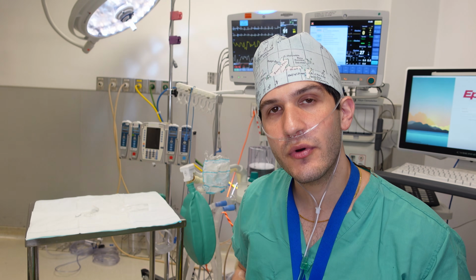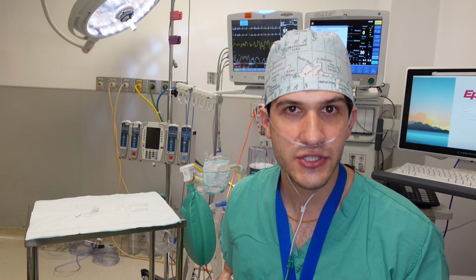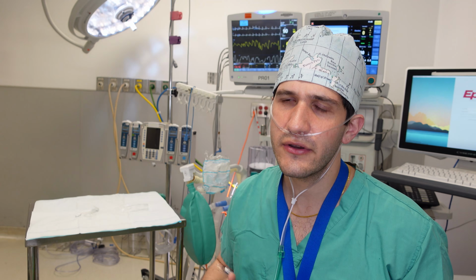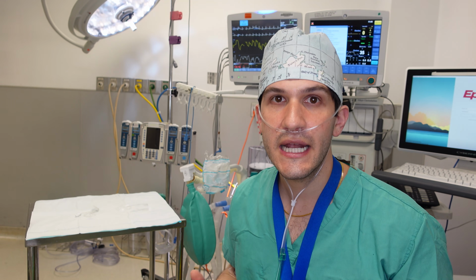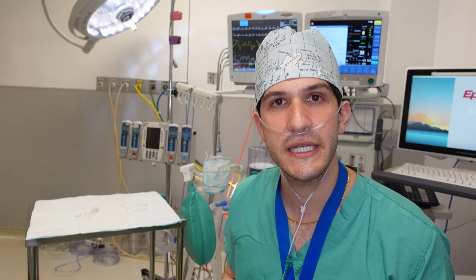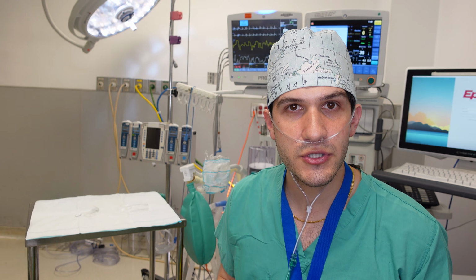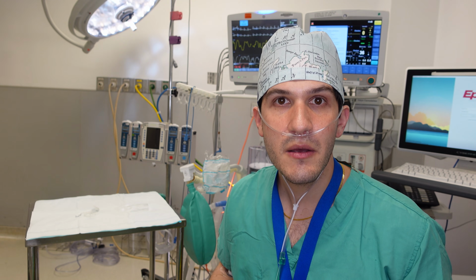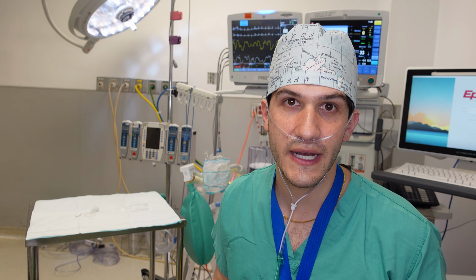And it's also important to have an eye on the temperature in case the patient's having an adverse reaction to medication. There could be an anaphylactic reaction that may be manifest as fever, and there can also be transfusion-related reactions when talking about blood products, and it's also possible to have a condition called malignant hyperthermia, which, as the name implies, involves a very high temperature, although that tends to be a later manifestation of that particular disease. But all of these reasons go to show that temperature is an extremely important factor to monitor for patients.